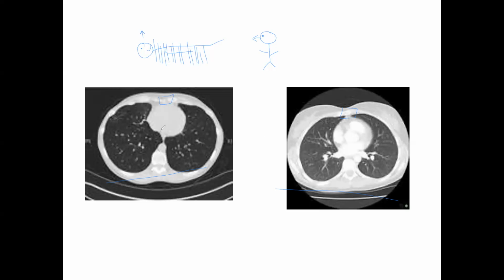One thing to note over here, if we're looking at the forces that might oppose ventilation, look at overall chest wall compliance. You can see based on this CT that this patient has significantly less adipose tissue in their chest wall than this patient does. You've got a lot more radial thickness over here.